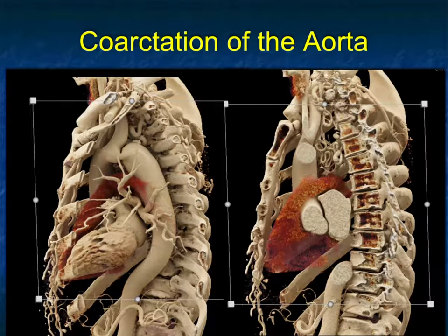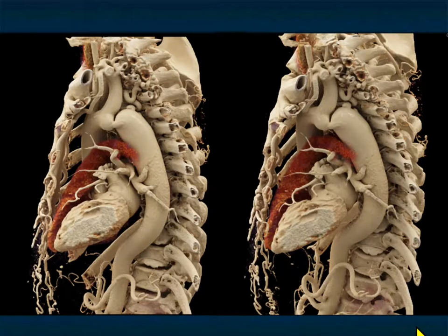Here's a patient with coarctation of the aorta, very nicely shown here past the left subclavian. There's a dilated left subclavian. There are multiple collaterals present, as there typically are in patients with coarctation of the aorta. And here's a range of projections showing you the dilated internal mammary arteries, the prominent intercostal arteries, and really nicely showing you the extent of the coarctation and what will need to be done. Whether a stent will be placed or they'll need to do an end-to-end repair will depend on what the surgeon thinks. That's a pretty tight stenosis, and the patient is, I think, in their 20s.